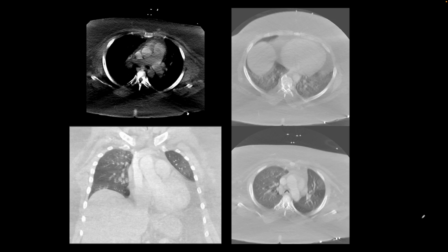This is our next patient, and this is important because the images on these patients show common findings in a particular demographic, which is more commonly negative for CT-PE studies. And these are young females who are obese, present with respiratory symptoms and get a CT scan through the ER. In these patients, most of the time the CT is negative for PE, and also the CT is negative for other findings that I will show you later in this video.